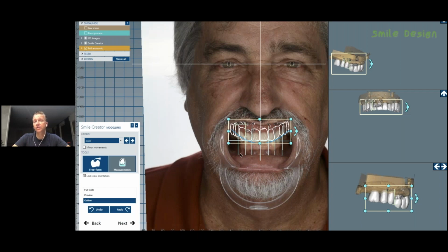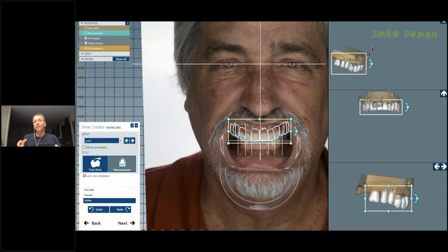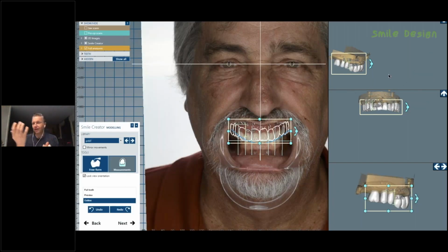On the right side of the screen here, we basically see the whole design in 3 dimensions. And that's an important factor, what I love about that software: any change we do here, we also change 3-dimensionally. So we never lose the control. We can create a beautiful 2-dimensional smile and look at the models, so it's not impossible. Here we have a real-time adjustment on both the 3-dimension and 2-dimension, which is absolutely helpful and shortens the working time a lot.